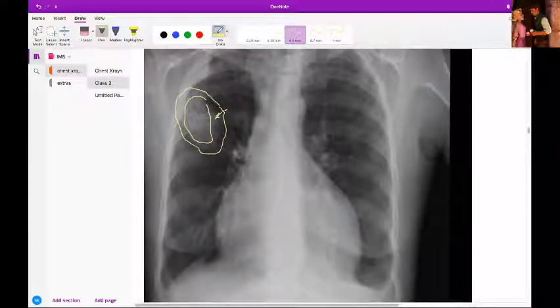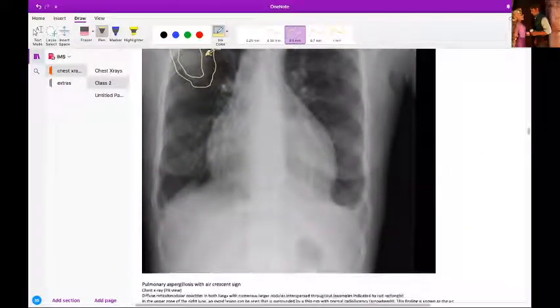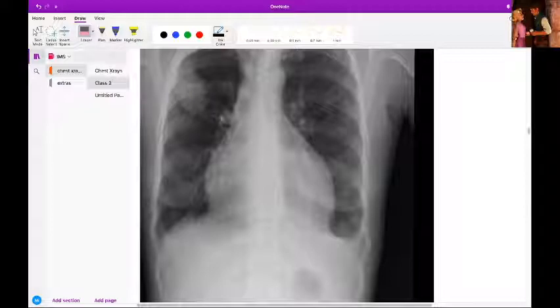It's kind of a pneumonia. Do you guys know which etiology? What can be the cause of this pneumonia? Fungal. Yes, this is aspergilloma, Aspergillus fungal ball. So this is called air crescent sign. There is an opacity, and then there is a translucent area around that opacity. You hear this thing called the air crescent sign. You can see it in an aspergilloma.